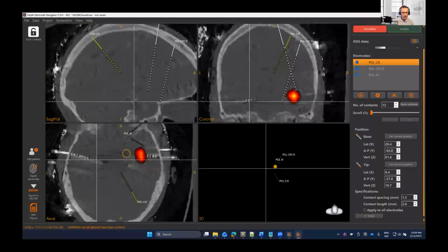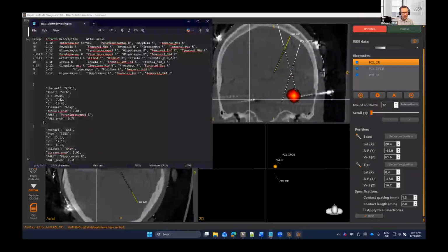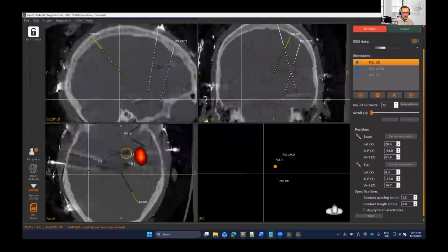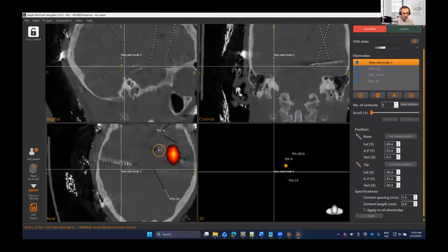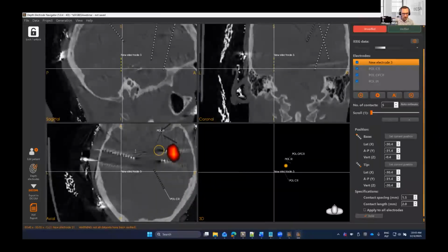My approach is that I prefer to go in the Z direction from bottom to top and look at the lowest contact. So the lowest one will be, in that case, the AL electrode. I will just put the electrode and go from the bottom, find the lowest one. So the lowest one is here.